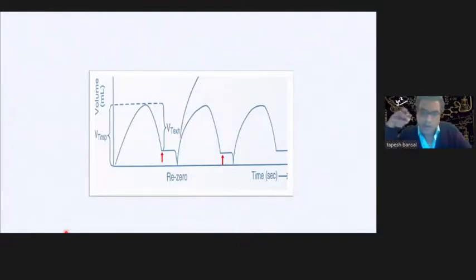So this is another question for you here. What is happening here? In the red arrows, what is being shown? Absolutely. So this is volume leak. As you can see here, volume is not returning to baseline. Correct.